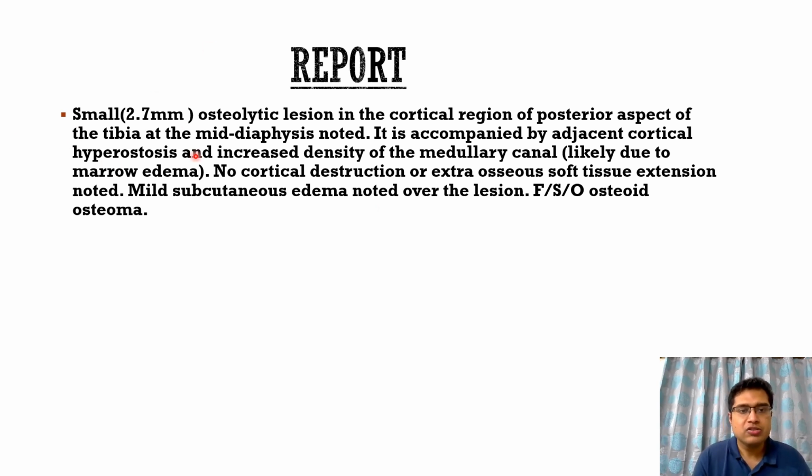That nidus is actually responsible for producing prostaglandin. So this is a very simple diagnosis, it's a spotter case, so it should not be missed. Even if the patient provides a history of trauma, most bone tumors will give a history of trauma. The important thing is that the findings are to be seen and reported.